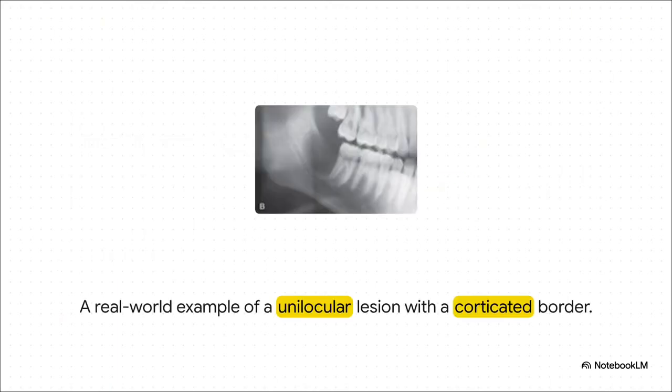Okay, so that was the diagram. And here it is in the wild on a real X-ray. You can totally see that single dark area, right? Now look really closely at the edge and, yep, there it is. That fine white corticated rim. It's exactly what we just saw in the drawing.